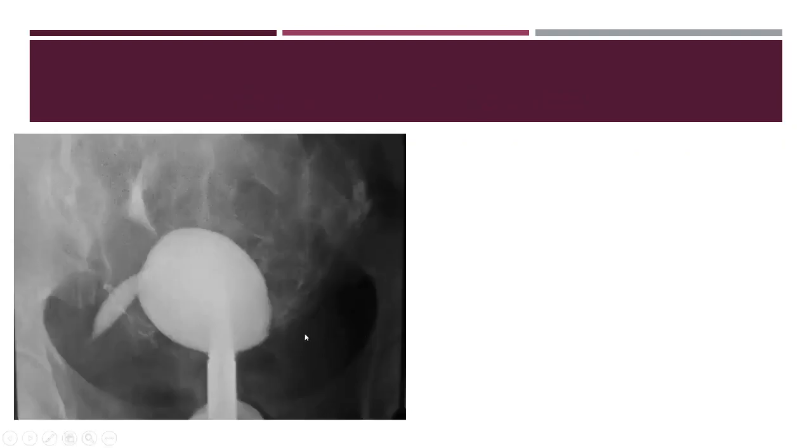What about this case? I have two endometrial horns, but what is this? It is a very odd appearance, but you have to do ultrasound. If you have a very odd appearance, you have to have a look by ultrasound.